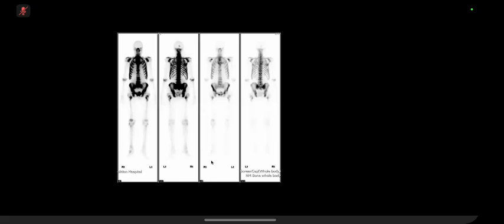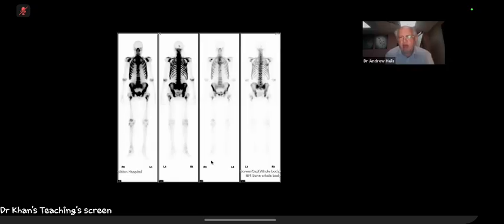In my differentials, I'll include significant metastases from a primary, or if there has been a recent radiation treatment, then that can signify this sort of appearance as well. I don't see anything in the kidney, so this is in keeping with a super scan, which is different to what I saw previously. So again, metastases with the super scan in my differentials, and other causes such as metabolic causes will be lower down my list.